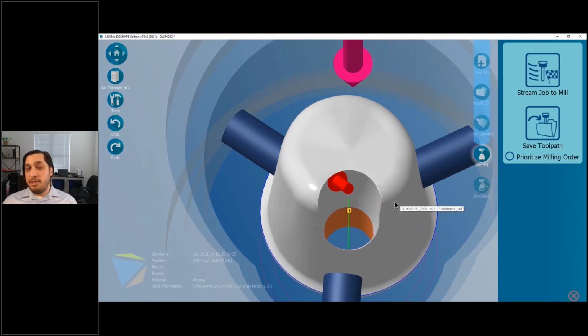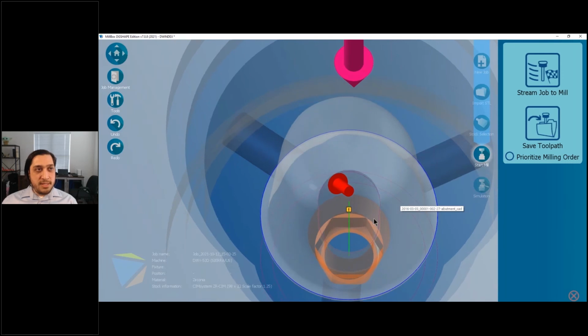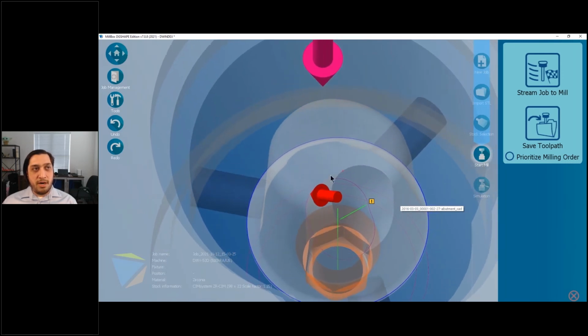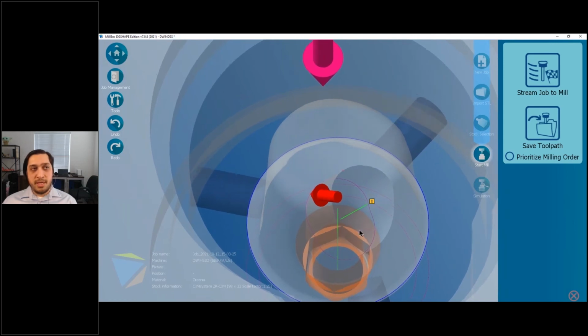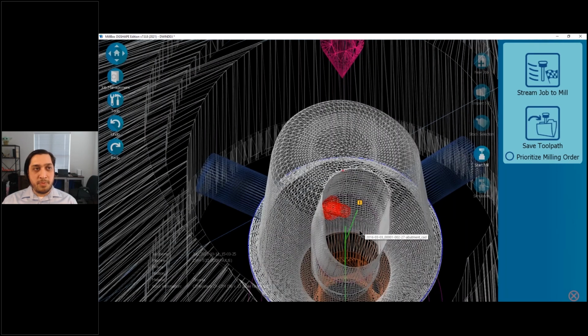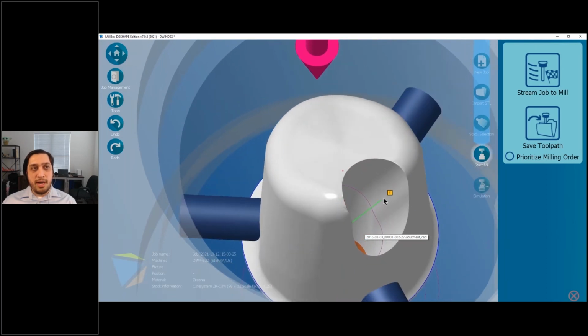Now, this is a very unique type of case because you can see here the screw channel itself is not actually cylindrical in shape, and you can see based off the profile that we generate here that it's almost like 2 cylinders that have been combined, and that's very typical for an angled screw channel. You're going to see this a lot on your angled cases.